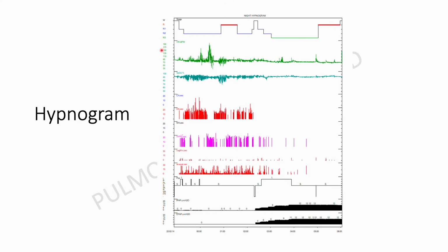Now, see how you can see this. There's a stark kind of irregularity in the sleep architecture of this patient, with almost no slow wave sleep and REM sleep all through. So, there's definitely a lot of advantage of looking at the hypnogram, because you are getting a nutshell of how the patient slept at night and whether there were any nighttime problems.